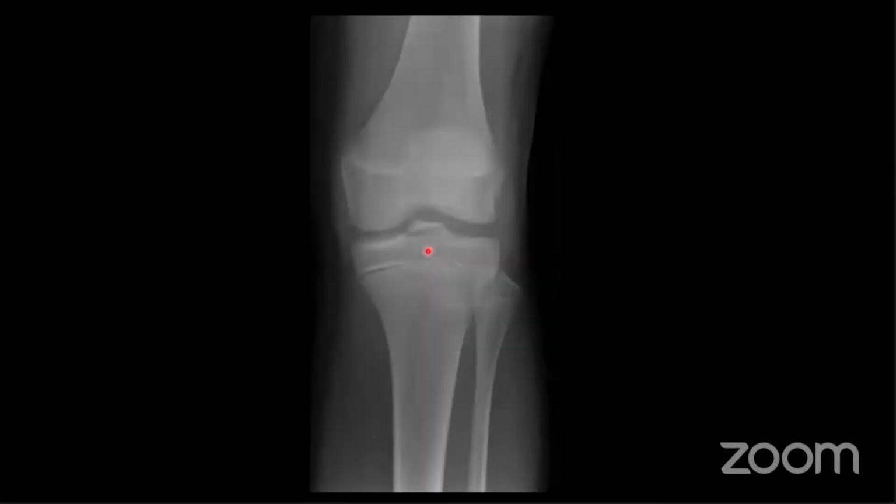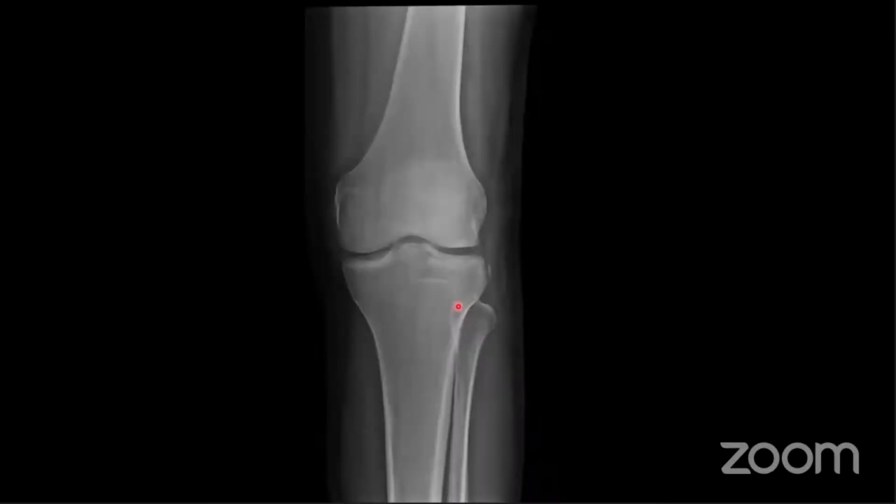Is there a head of fibular fracture? No. So I think this is growth plate irregularity. I'm not sure that's an acute fracture. I think there's partial fusion of these growth plates actually. I think they're probably slightly older, maybe a teenager. Right. Okay. What do you guys think about this one?